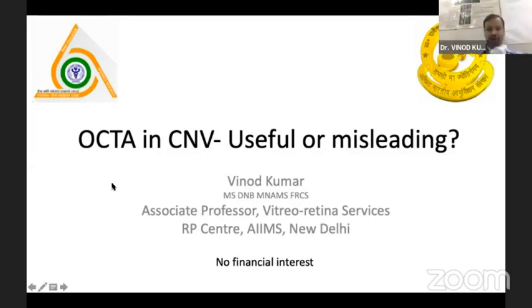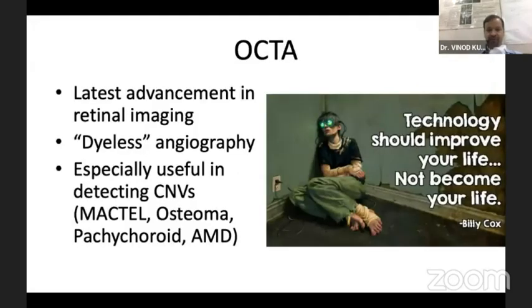So I'll be speaking on optical coherence tomography angiography in choroidal neovascularization. Is it useful, or can it be misleading at certain times? I'll be sharing a few of my cases to highlight this.